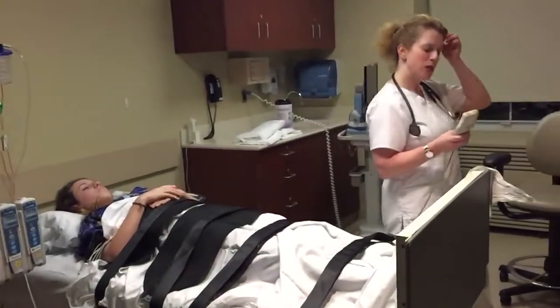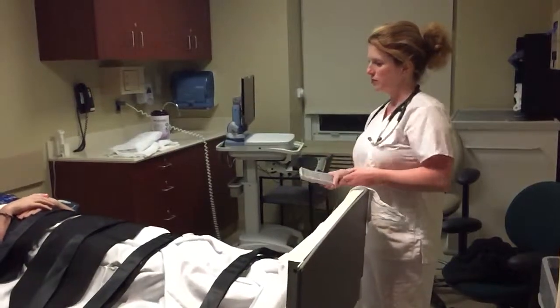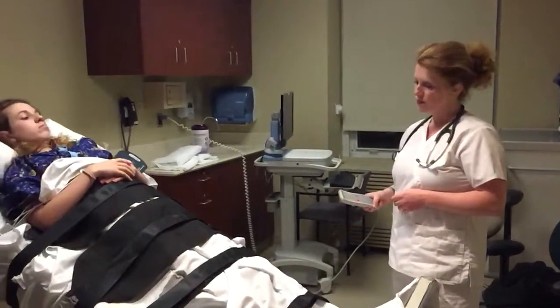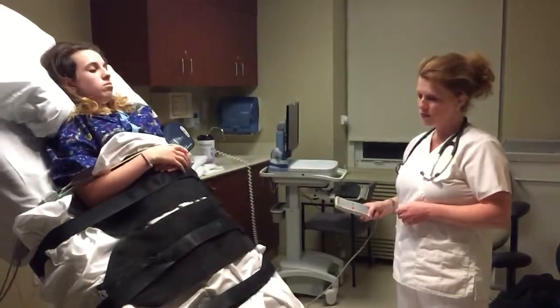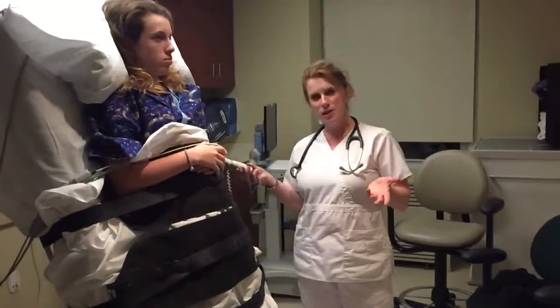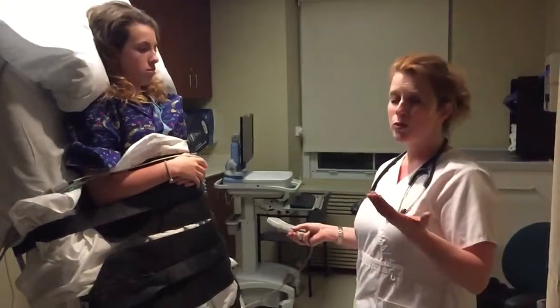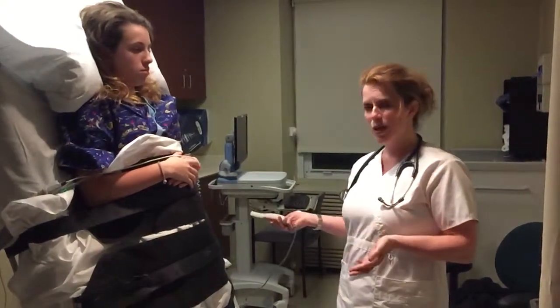But suppose the patient does not have a syncopal episode. After 30 minutes, the doctor decides, according to the patient's age, comorbidities, and medications that they're on, whether to give medication.